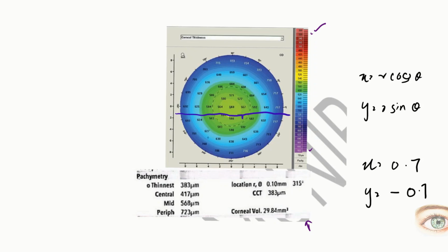So this tells us that the cone is right here. The y value should not be greater than 1 millimeter. Otherwise, there is a huge risk of developing keratoconus or any other ectatic disorder.